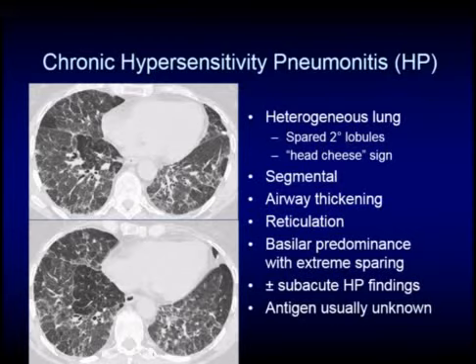This is characterized by what we call very heterogeneous lung on CT. And so we've got areas of ground glass attenuation, reticulation, and then we have these areas of hyperlucent lung or black lung that look to be sort of groups or isolated secondary pulmonary lobules that are hyperexpanded. And ultimately, if you do expiratory imaging, you wouldn't be surprised if they trap a high degree of air. So this, at TLC, when you see the ground glass reticulation admixed with air trapping, this is what we call the head cheese sign.